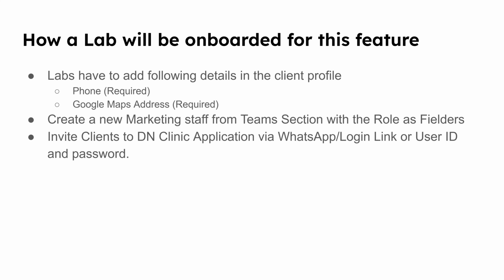How will the lab be onboarded with this feature? Currently we have to make a few changes to how you do the workflow part. We'll discuss that. To get started with this feature, you have to do the following things. You have to add the following data. There's a demo for it, and I'll show you that as well.